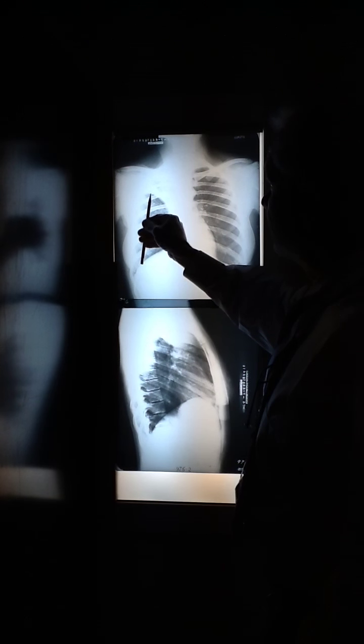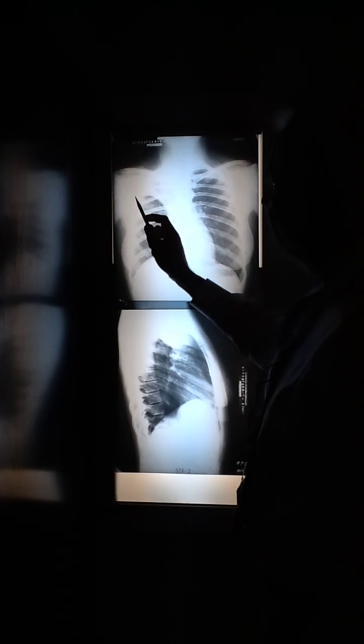Now, what's this? Fissure. Minor fissure. Yeah, we know there's a well-defined, horizontally oriented boundary in the right lung, but not there, right? Down here, yeah, but not up here. So this is opaque all the way to the apex.